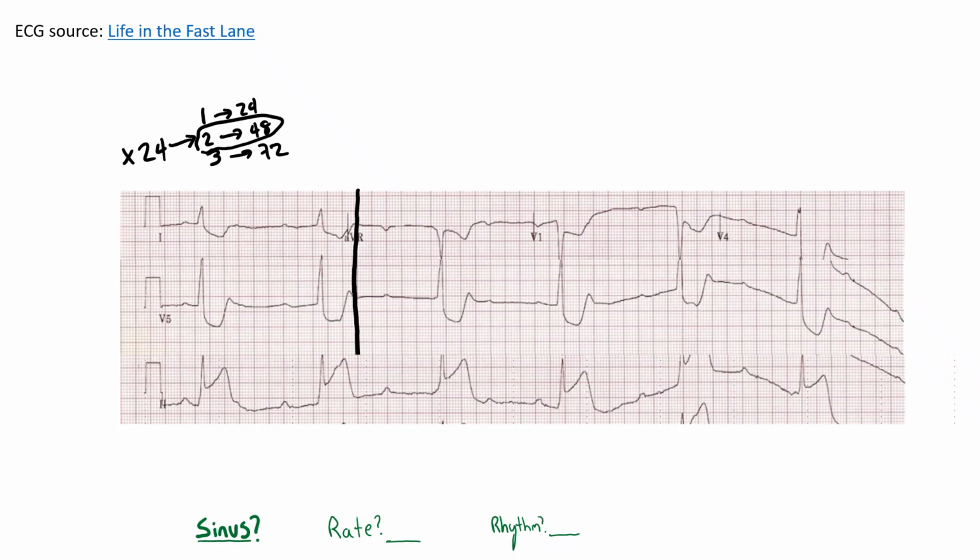Let's not get bogged down in explaining this right now. Since this is slow, you could also count QRSs, which gives me 36, 6 complexes times a 10-second rhythm strip. But let's be clear here. I'm not trying to get an exact number. I just want a sense of, is this fast? Is this slow? Is this about normal? Regarding regularity, the QRSs look grossly regular.